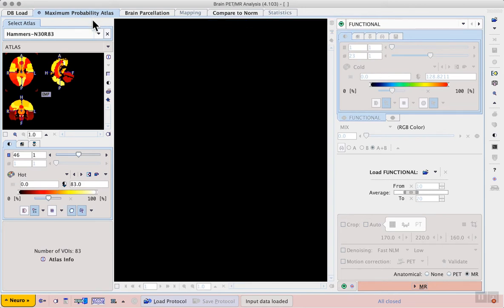In this demonstration, we will go through the first workflow, using data from an experimental PET tracer targeting an enzyme involved in tau protein tangling. Extra more advanced exercises using this data for kinetic modeling and parametric mapping are available. Here we focus on the basics of the Neuro Tool, so you should ask the Pmod team for more information.